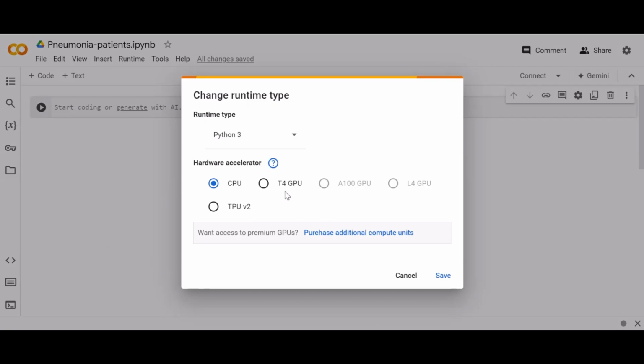So I'll be using a GPU because if I use a CPU for my application, it will take quite a long time because I'll be using a CNN model, which is quite complicated. Also, it will be working on images. So the application itself is quite complicated to handle on its own using a CPU. So I need more computing power. For that, I'll be using a GPU.